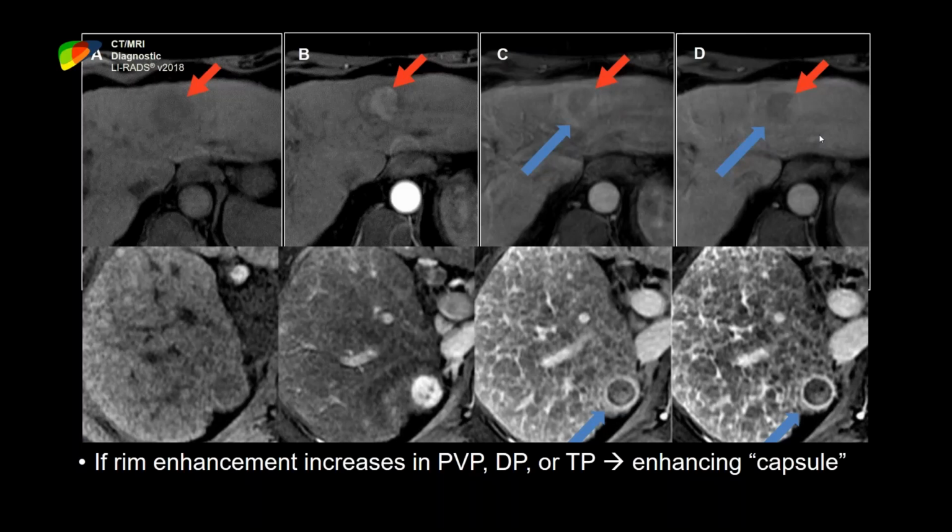Okay. So Khaled, let me just say a couple things here. This is a very complicated topic, and so it's not simple at all. In the current definition of LI-RADS, washout requires that there is some degree of de-enhancement of the observation relative to the liver. So if the observation appears to be getting darker over time, even without making actual measurements, if it looks like it's getting darker, we call it washout.